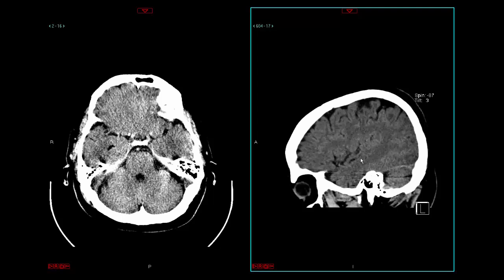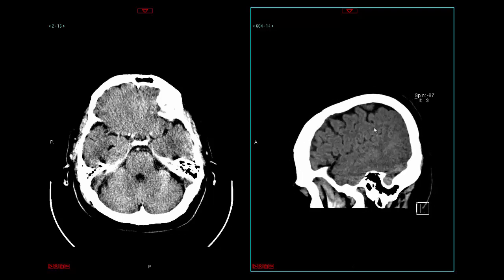Now, if I scroll a little bit back and forth, you don't get a great appreciation for it, but this being the temporal lobe here, you can maybe vaguely delineate the superior temporal sulcus, which may be going here. And then again, this is probably pieces of the sylvian sulcus. Once again, this is the supramarginal gyrus that borders or hugs that.